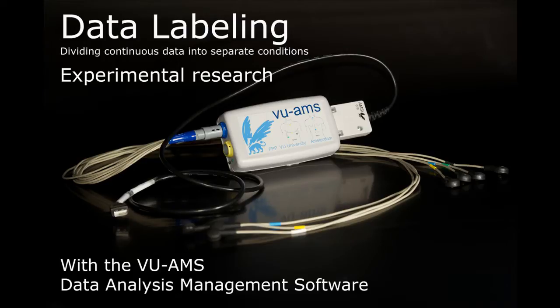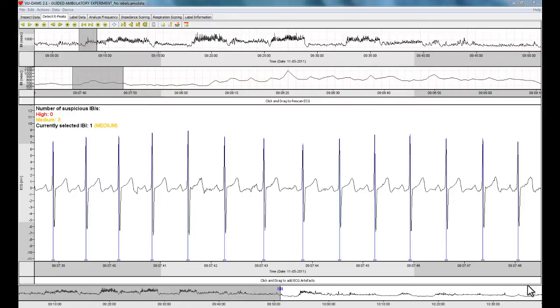This instruction video explains how to divide the data collected with the VU-AMS device into logical periods for further analysis. We do this with the data analysis and management software that comes with the VU-AMS device.